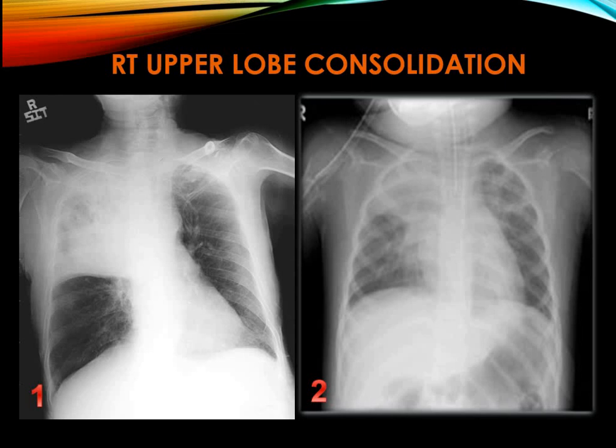فإذا نرجع للتسلسل معنا. إذا نحن عندنا patchy opacification without loss of volume، فمعناها نحن عندنا consolidation، والlocation معناتها هي in the right upper lung lobe. Chest X-ray number 2 is another example of right upper lobe consolidation due to pneumonia، ولكن هنا في pediatric age group.